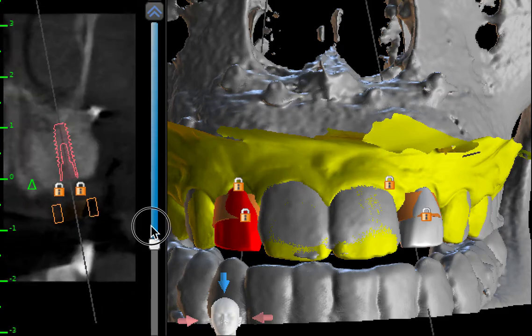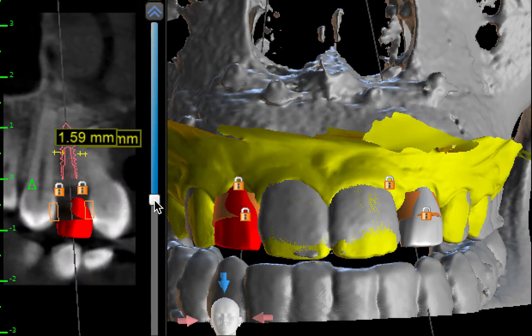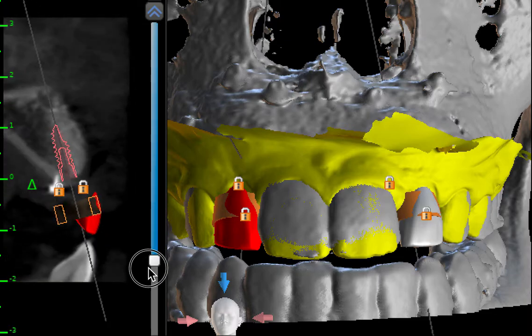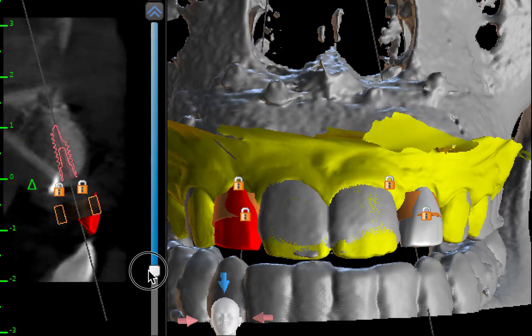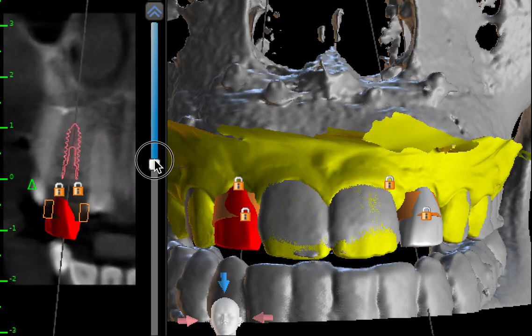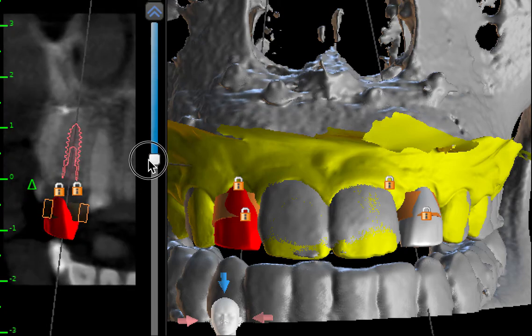Very good spacing between the teeth, and the same on the other side where we have a little bit less space. A 3.0 implant has been chosen, and you can also see how much bone we have, a good amount of bone. Again, a Meisinger master pin on the palatal that needs to be removed the day of the procedure, but this is very beautiful. This is an excellent grafting outcome.